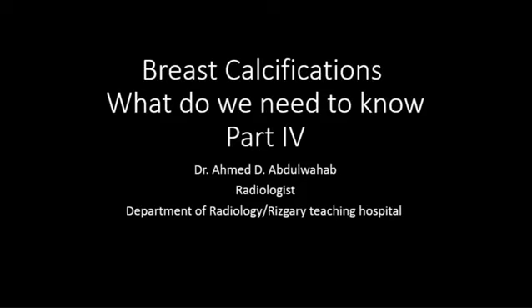Okay, good morning everyone. Today we will continue with our presentation on breast calcifications. What do we need to know? This will be the fourth and final part, and by that you will have a 4-session presentation of 4 parts that explains almost everything you need to know about what to report if you see a calcification on a breast on a mammogram. Anything from macro to micro to dystrophic to whatever kind of calcification you see.